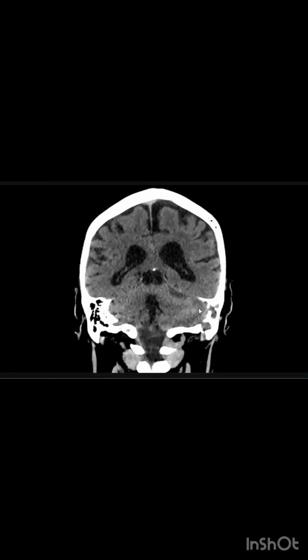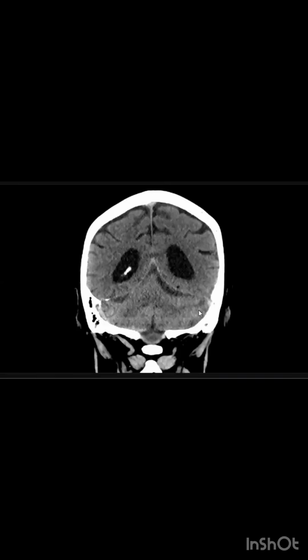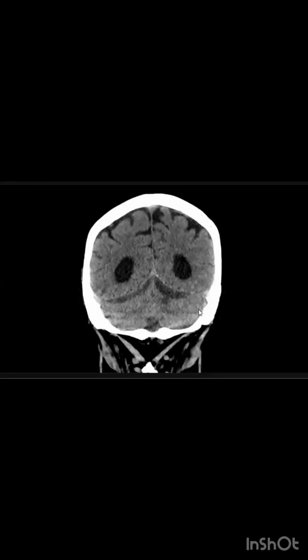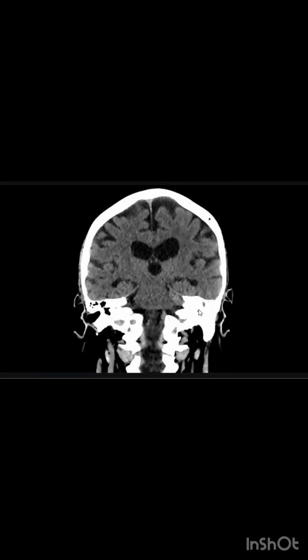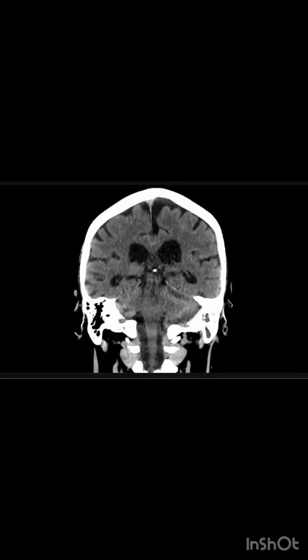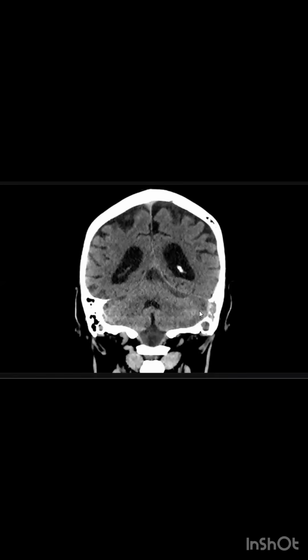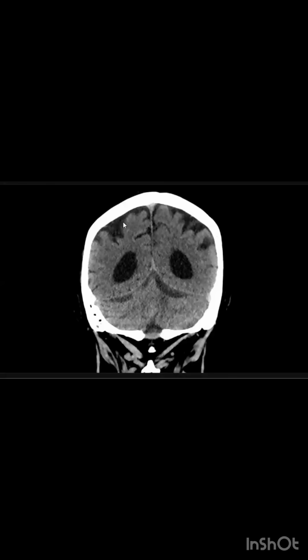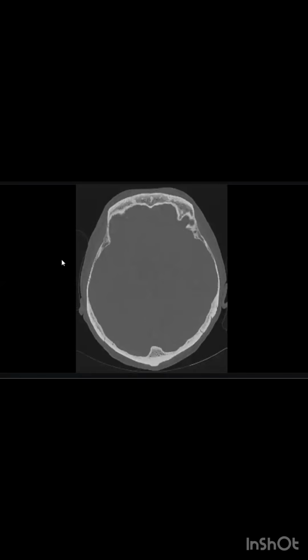My diagnosis is subdural collections, as there were some enhancing margins noted on the post-contrast sequences, and there is also some opacification of the mastoid air cells as well. I would like to see the bone window also, as the patient has a history of fall, to look for any underlying fractures.